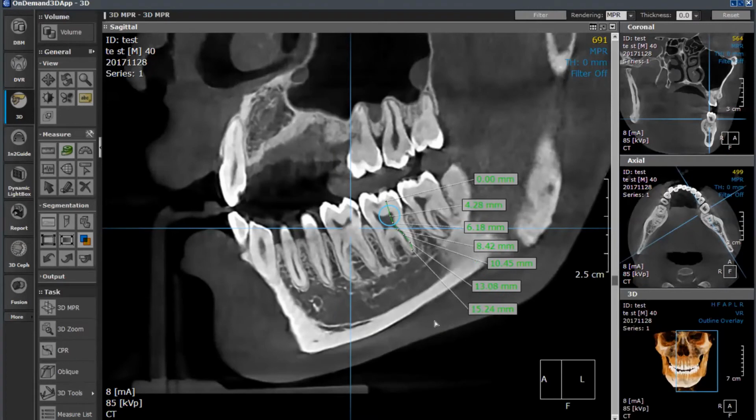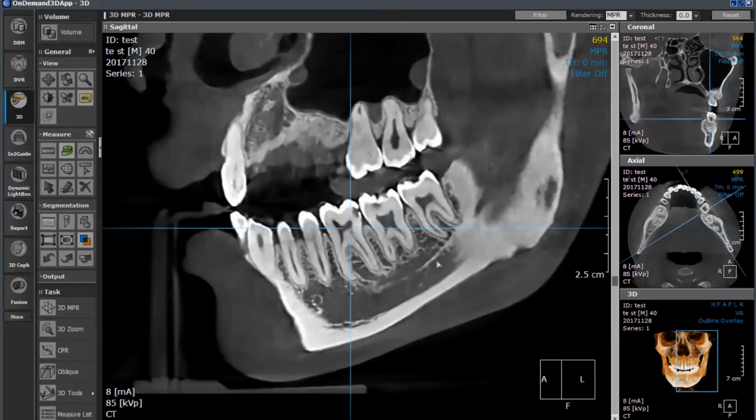And that just gives you the ability to predict how you're going to obturate it, what have you. So in this case, if you want to erase it, all you've got to do is click on the number, click delete, and you're back to 0 again, and you can look around.